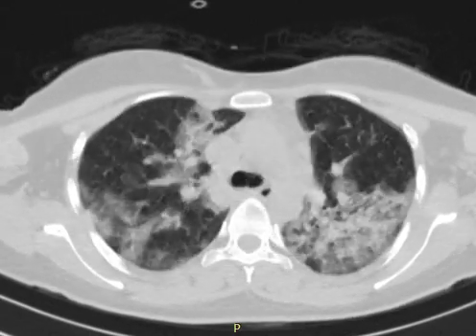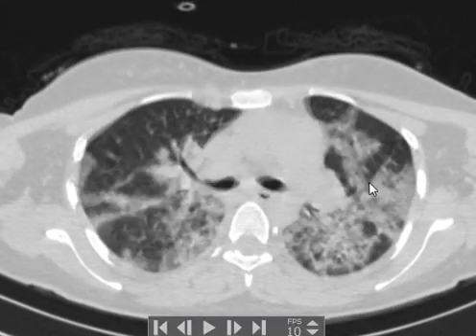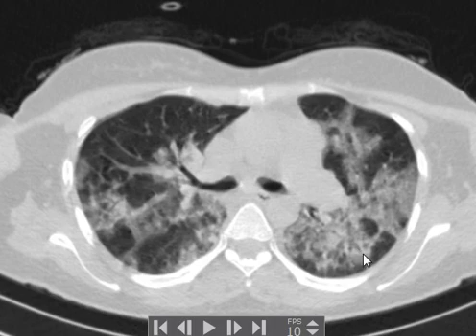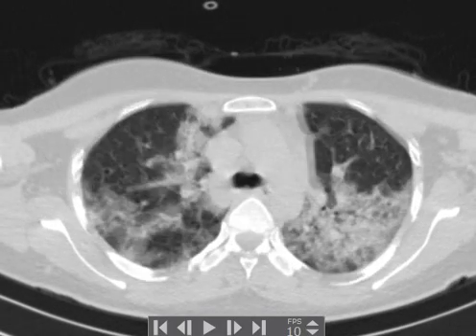You can see it obviously in these parts. You can see that this lobule is affected, and this lobule is affected, this lobule is affected. It is very well defined, as opposed to what you expect of an ill-defined pattern. It is a well-defined pattern of diffuse ground glass opacification with airspace opacification and some interlobular septal thickening causing bilateral ground glass opacities.